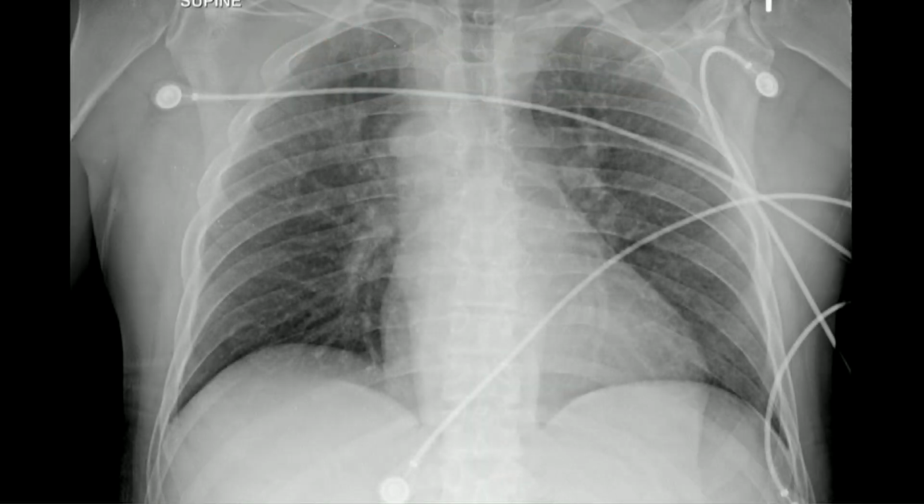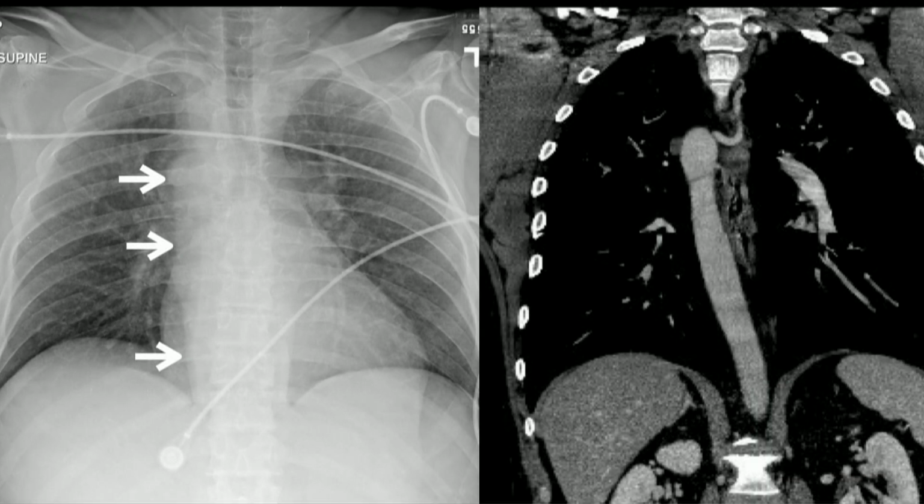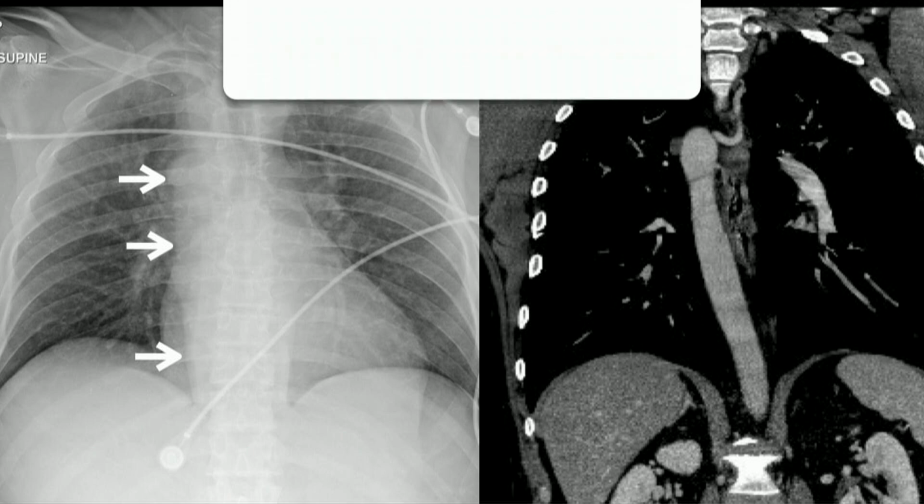Not the greatest case, but this was a patient with aortic coarctation, resulting in an abnormal contour of the left periaortic interface. Here we have another patient, and the abnormality here is on the right. This was a patient that had a right-sided aortic arch, descending down, resulting in displacement or widening of the right periaortic interface, which we usually don't see well at all if the patient has a left-sided aorta.